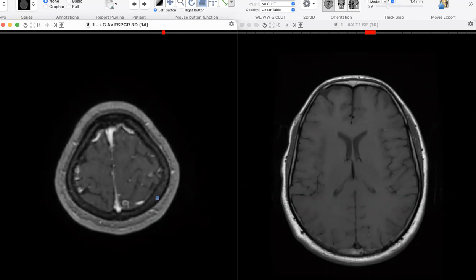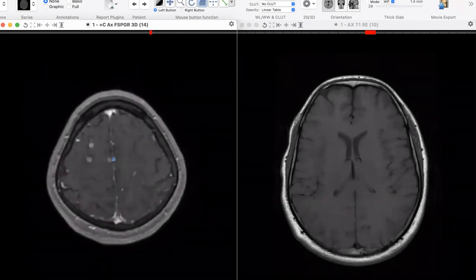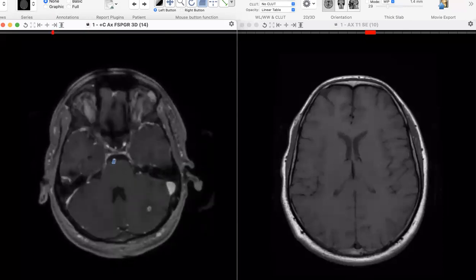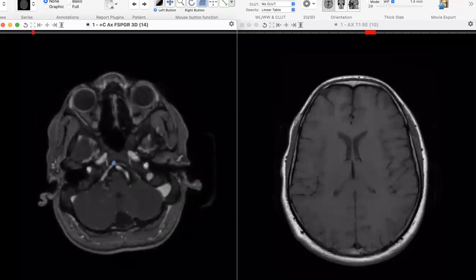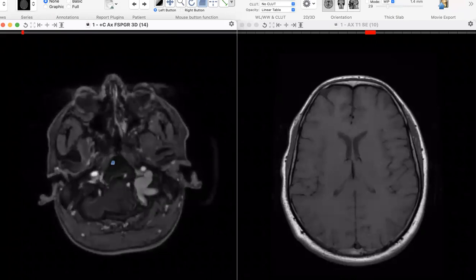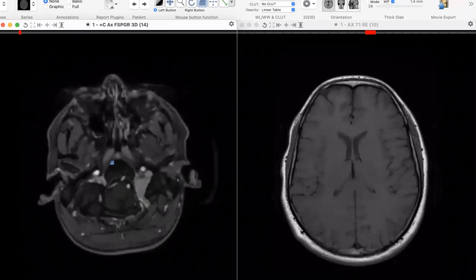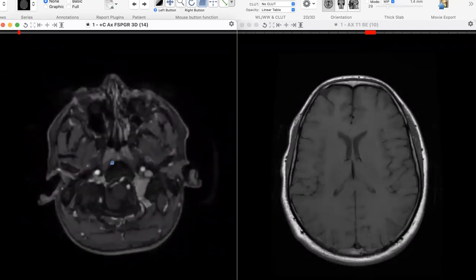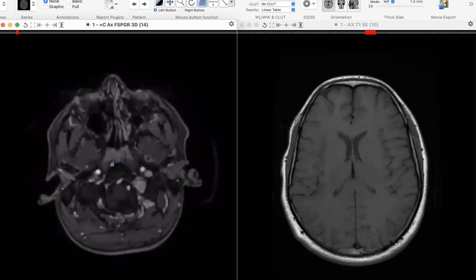There is some more clinical history in this patient. Actually, the patient was also complaining of swelling in the left preauricular region. Preauricular region. Yeah. Swelling in the preauricular region would most likely be secondary to some lymph node enlargement. Right preauricular region, I cannot, left. Yeah.